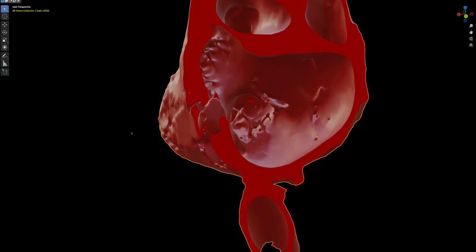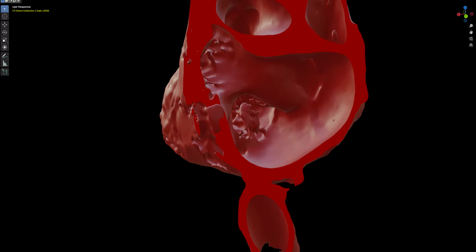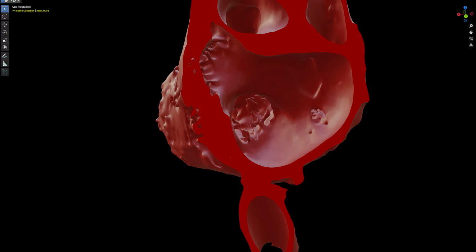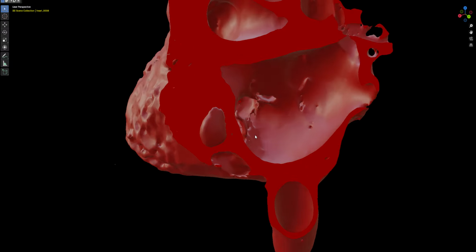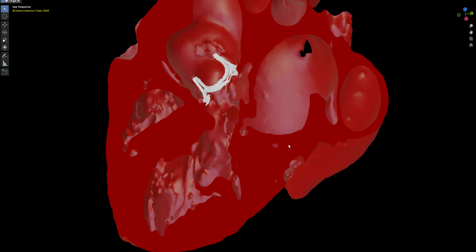I've paused this in clip 8 of the 19, because that's where I believe this most closely represents where that defect between the LVOT pseudoaneurysm and the left atrium sits, right around here. It is exaggerated, because if I go to the next clip or the other side of it, you can see how it disappears. But this does, I think, at least represent where I believe it sits.